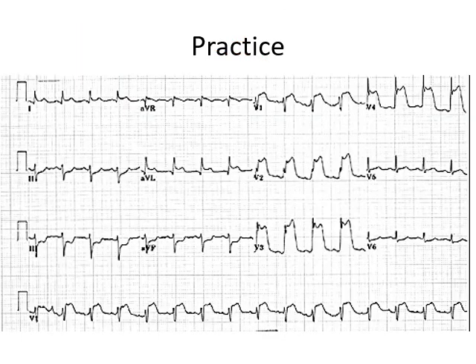Let's have a look at one more ECG. Have a look at ST segments in different leads. I'm going to take a 1-second pause.